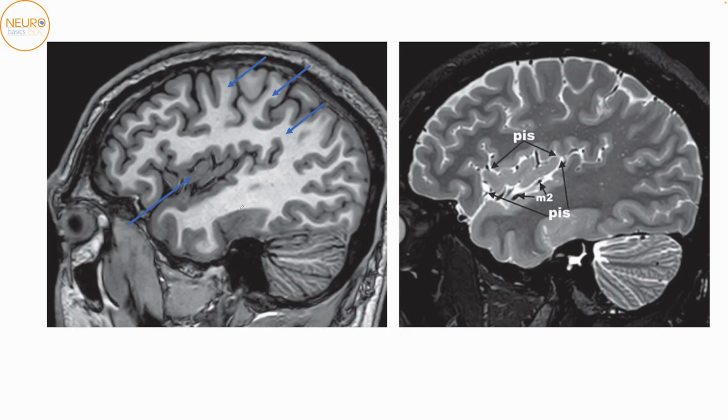As we go further, more towards the midline, we're able to see a little bit more important structures. Now we're able to see the insula. There's a Sylvian fissure and the insula is now obviously seen. You can use the thin and thick sign again to identify that this is the precentral gyrus and the postcentral gyrus over here. Again, where the Sylvian fissure is ending is the supramarginal gyrus. So that's another way to identify the pre and the postcentral gyrus as well. On T2 imaging, we can see all the M2 MCA branches running within the insular cistern.